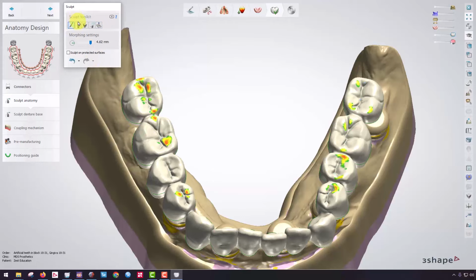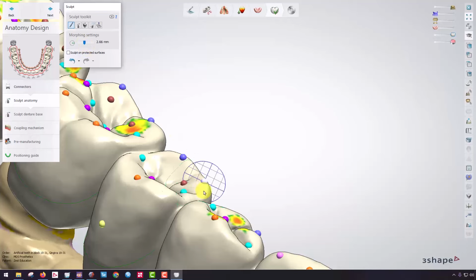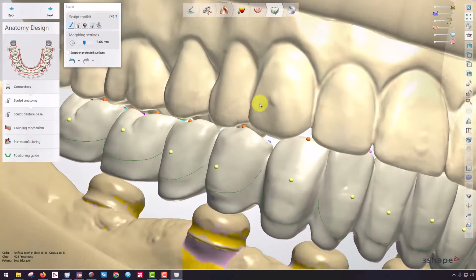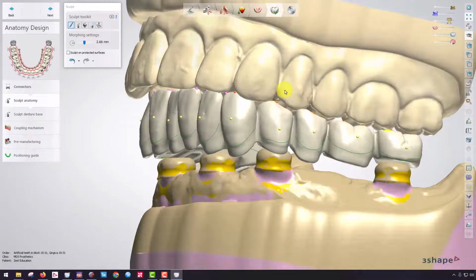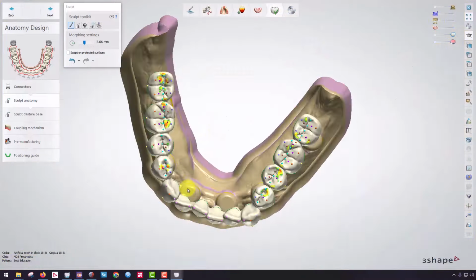But I'm like, oops, I don't have a little edge touching right in here. No problem. I'm going to give my patient a little bit of a better bite right in here. Almost. A little too much. So I want to keep this as lingualized occlusion. That's pretty good. And overall, then we're looking pretty good.